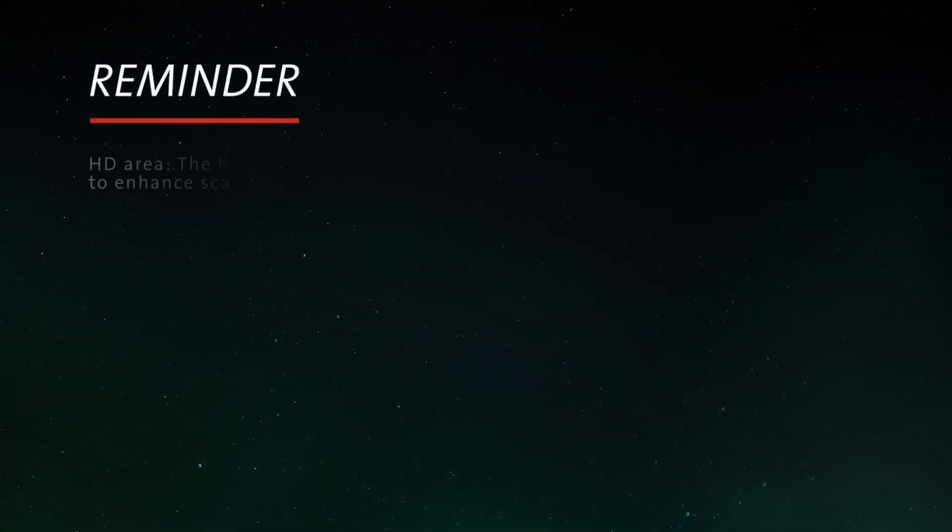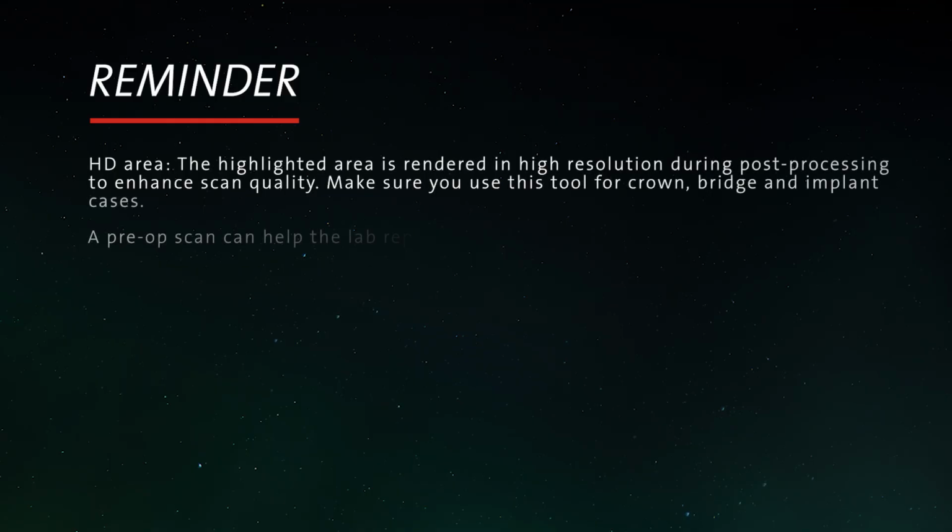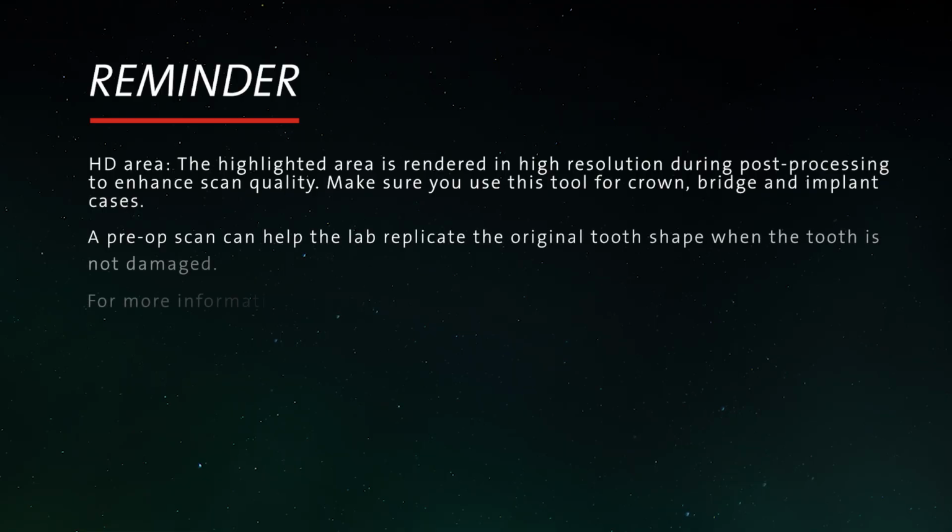Reminder: for the HD area, the highlighted area is rendered in high resolution during post-processing to enhance the scan quality. Make sure you use this tool for crown, bridge, and implant cases. A pre-op scan can help the lab replicate the original tooth shape when the tooth is not damaged. For more information, refer to the IFU.